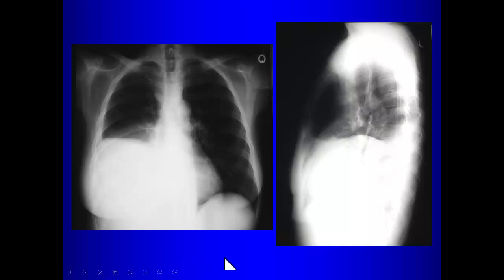Put the patient on the side. So what side would you want down? Right side. Right side down, so you would order what? What view do you order? Right lateral decubitus. So right side down is a right lateral decubitus. The blackness of the lung should go all the way out to the edge of the ribs. Here it stops here because this is the fluid layering against the chest wall. So with the right lateral decubitus view, we can see the fluid layering out here against the chest wall, and it shows that there's a large free-flowing right pleural effusion in this patient.